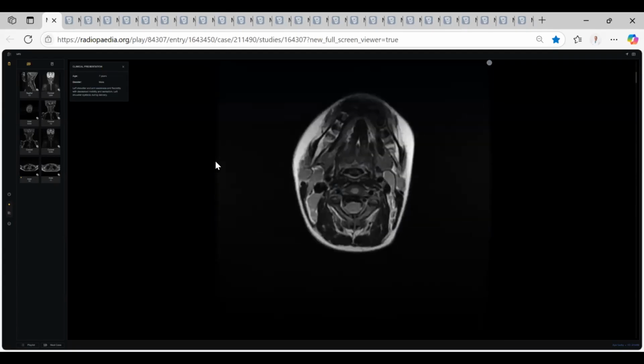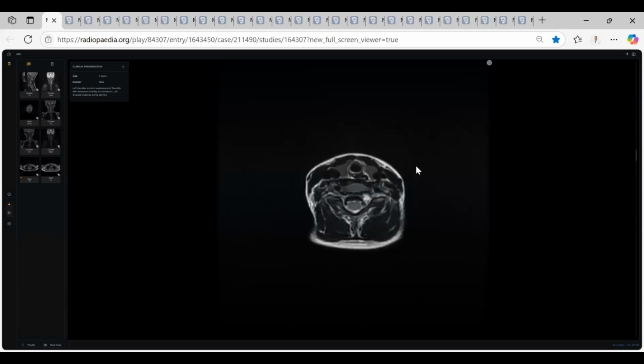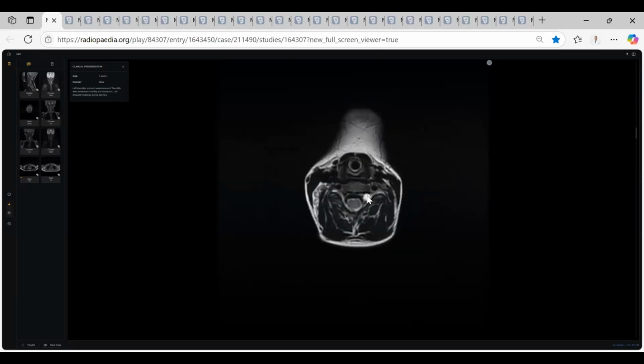If I told you this baby has a birth trauma: pseudomeningocele. Excellent. Look here. This is the exiting nerve root. Could you detect it? No. Excellent. It is replaced or occupied by a dilated CSF space. So what's your final diagnosis? Left-sided multi-level pseudomeningoceles, likely related to the birth trauma the child had.